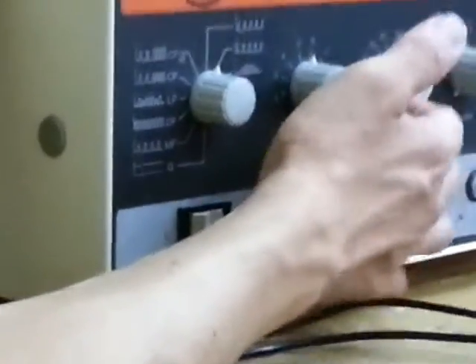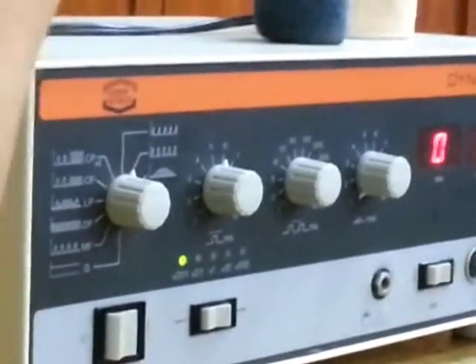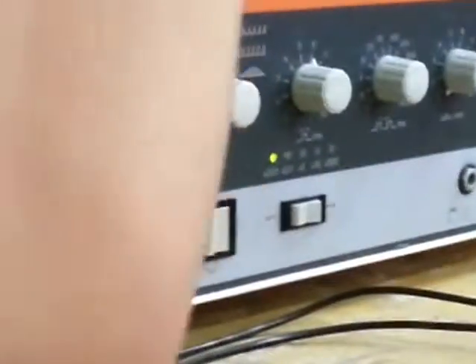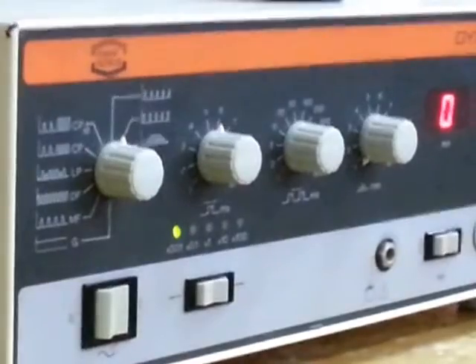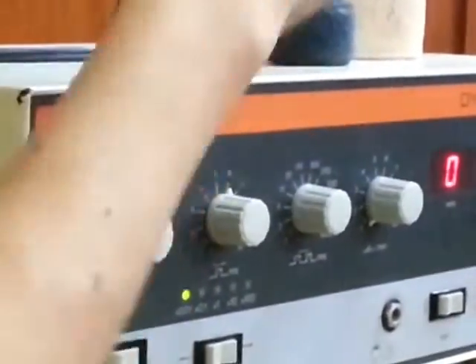Okay. So next here, this would be your pulse interval. When you say pulse interval, it is the duration between pulses. So this is the off phase. When you say pulse, it's on. Interval means the gap between pulses, so that would be the off phase. Off, so it does not give current.